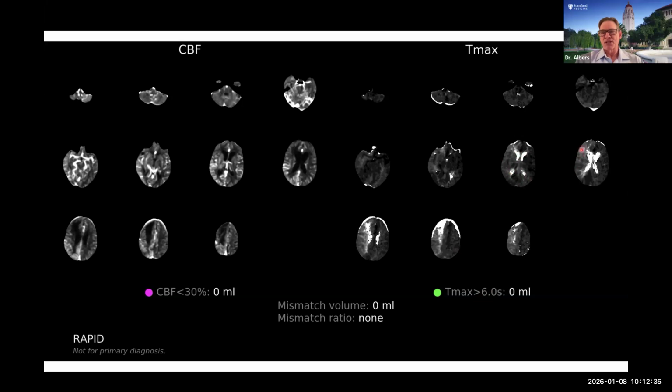So if I look at this patient's right hemisphere, I can see that the right hemisphere has a bright area, and this is compatible with carotid occlusion, which is what this patient has. So the carotid occlusion is chronic in this case, and it is giving you this mild delay into the right hemisphere. We also see some regions where it is bright white in the right frontal lobe, same as the ventricle. So this is telling you blood flow is never arriving. So this is an area of encephalomalacia for the old stroke that occurred when this patient had the right ICA occlusion.